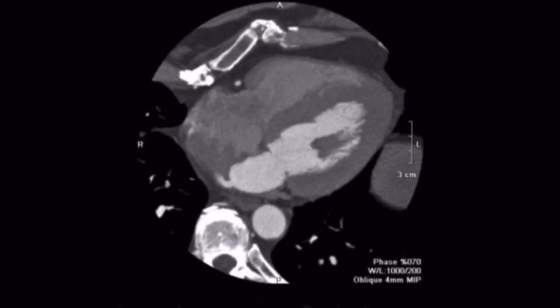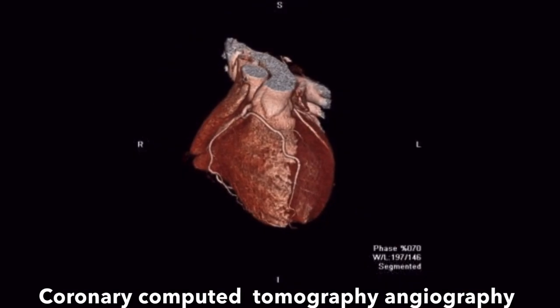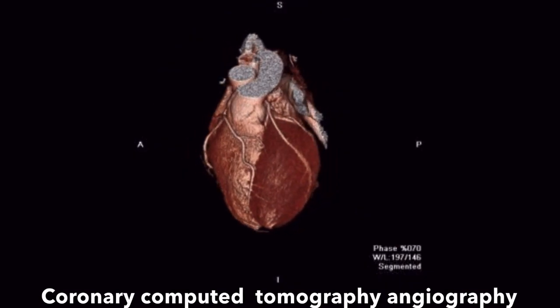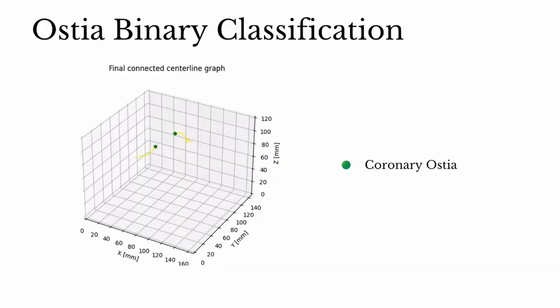Coronary CT angiography is a non-invasive, cost-effective method providing details on coronary structure, surpassing more traditional techniques in terms of cost and time. In our project, using deep learning on CCTA images, particularly convolutional neural networks, we aim to determine whether a point inside or nearby a coronary artery belongs to a coronary ostium.